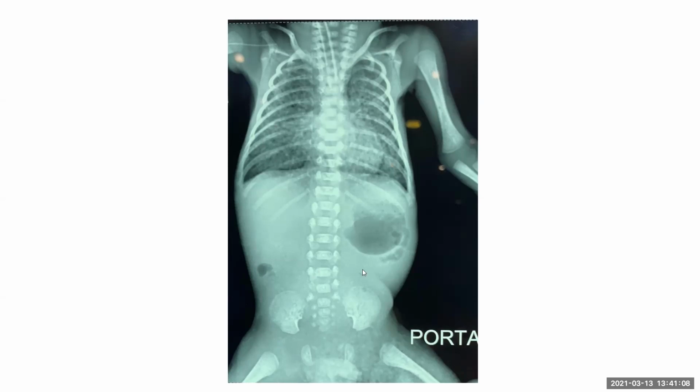You're very right, this is pulmonary interstitial emphysema, but you see this streak of air over here. There was bilateral pneumothorax as well. And you very rightly said this is a premature child, and even the air has not reached into the whole of the bowel as yet. So this was RDS, and probably due to the ventilation and high pressure, they've introduced more air and caused pneumothorax.